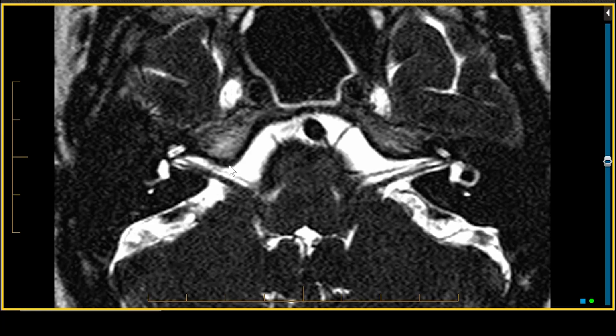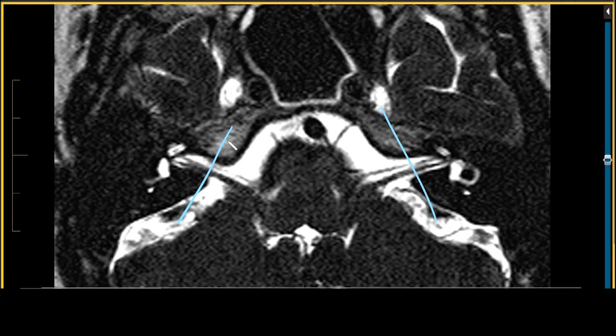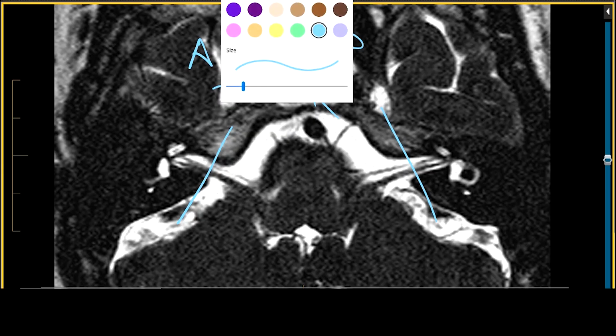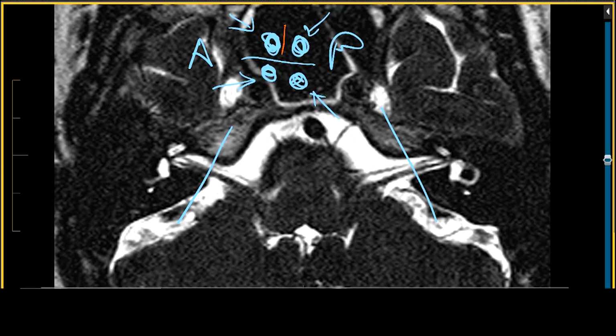So if I were to produce a sagittal oblique like this or this, and then I had you look at that sagittal oblique, you'd see 4 round structures like this. So this would be anterior, this would be posterior, and high up front, you would see the facial nerve. So 7 up, coke down. Here would be your cochlear nerve. And in the back, you'd have the superior vestibular nerve and the inferior vestibular nerve, and these would be separated by the crista falciformis and might be partially separated vertically by the structure known as Bill's bar.